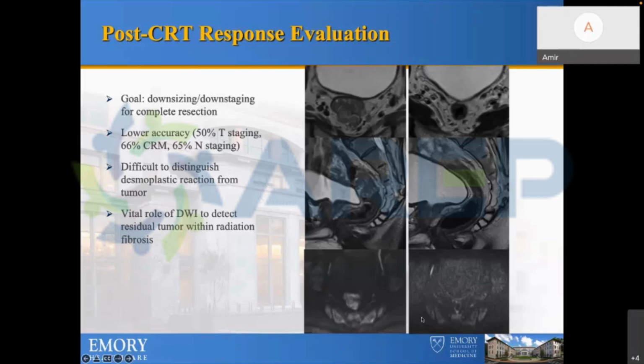You can see the sacrum here. So basically, this is gone. So this is a qualitative assessment. This is not a quantitative assessment. Basically, if I see a little bit of tumor is gone, but a little bit of tumor remaining, I just say incomplete response, meaning that there's a little bit of viable tumor still there. So the assessment would be more qualitative, and you definitely need to have the baseline imaging. I hope I was able to answer your question.